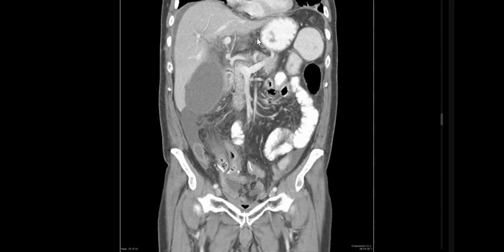Today, some of the acute inflammatory causes, whether affecting the bowel itself, as in case of appendicitis, ileitis, diverticulitis, or other organs like cholecystitis, like pancreatitis, hepatic abscess, and so on. So please try to see as many as you can regarding the complications.